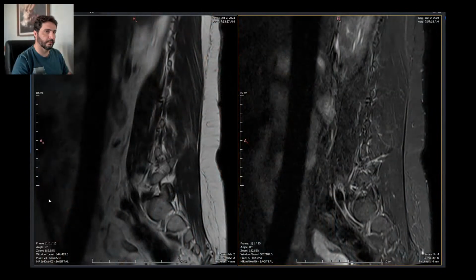Let's grab an MRI scan from the queue. It's downloaded. I'm going to share my screen so we can report it. Oops, now I have the microphone. Yes, this is the microphone. I'm sorry, I know nobody was able to hear what I was saying. It's okay.